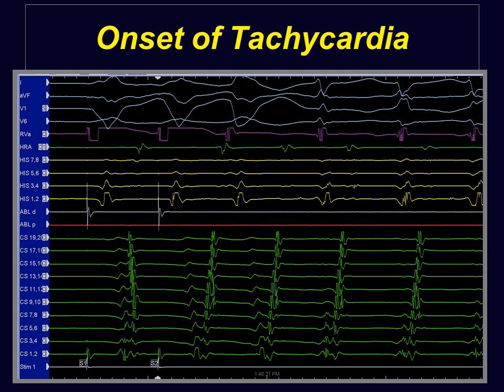You also can have a tachycardia start like this, a drivetrain, an extra. A drivetrain is fusing, probably AV node and potentially an accessory pathway. The extra only goes through the pathway. You have a non-sustained bundle branch re-entry, which is fairly common in the lab, and that conducts through the presumptive pathway. And then you have a narrower QRS with a shorter VA interval.